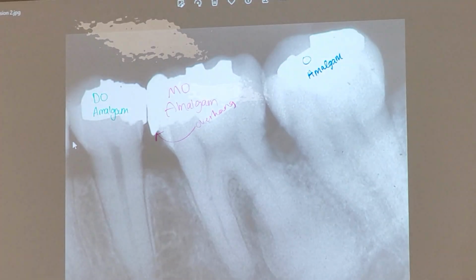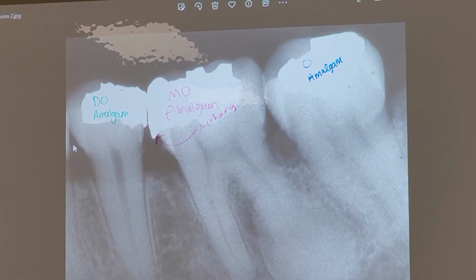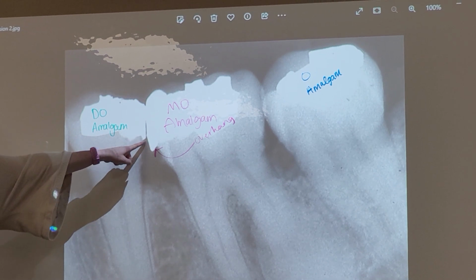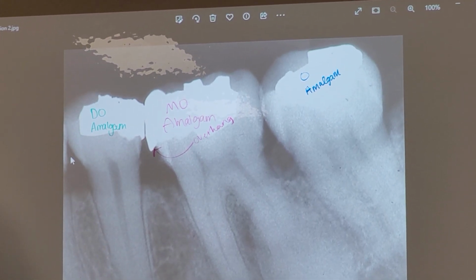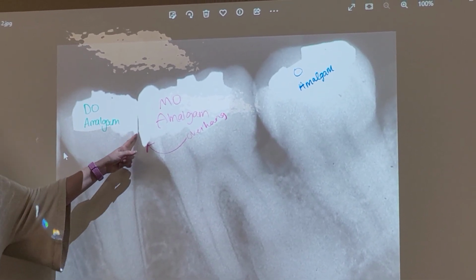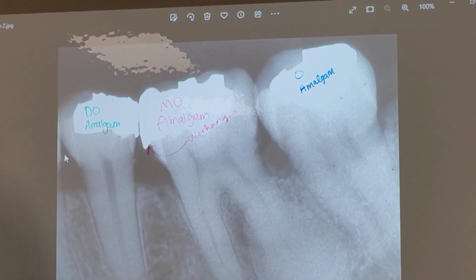Okay, pass your pens to the people that haven't had a turn yet. So then on the other one, is that an overhang too? Yeah, I see what you're looking at, that's still white. Could that be considered an overhang? Yeah, I mean, if I was catching something right there, I would consider that to be an overhang. This one's definitely an overhang.